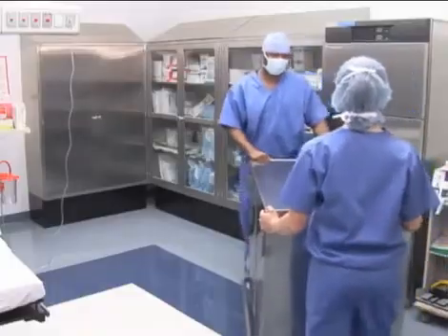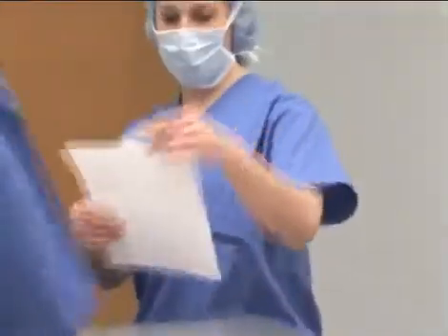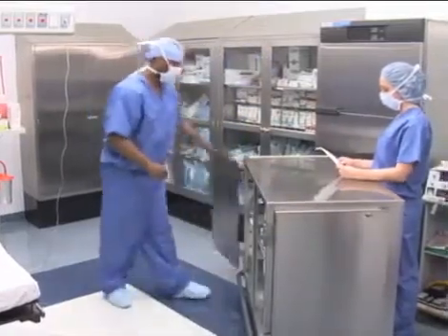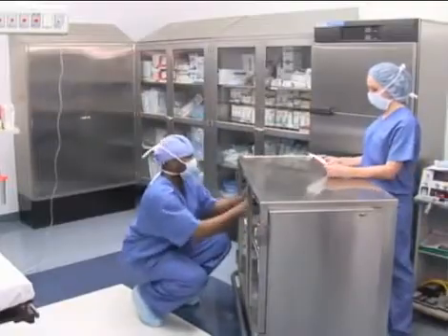The method used for gathering supplies for a surgical procedure depends on the system used by the health facility. The case cart method is most commonly used. Sterile supplies are prepared and gathered in a variety of ways. They can be gathered by the central supply or sterile processing department and placed on a stainless steel case cart, or they can be gathered by members of the OR and then transferred to the surgical department for the procedure.